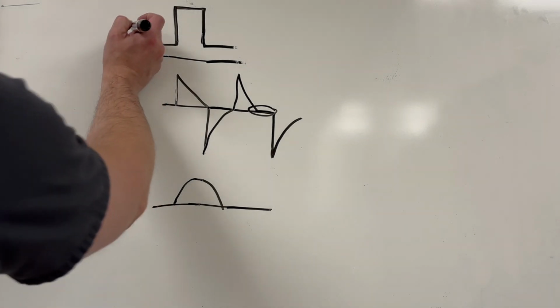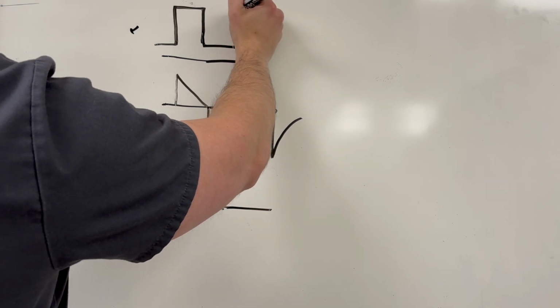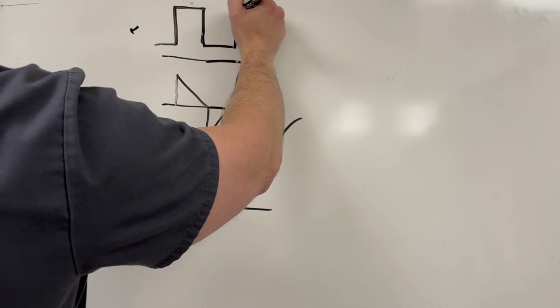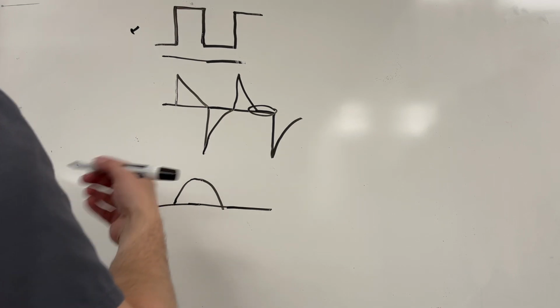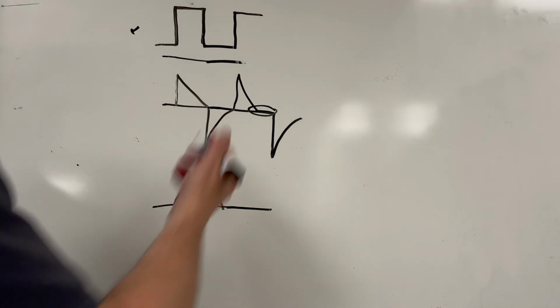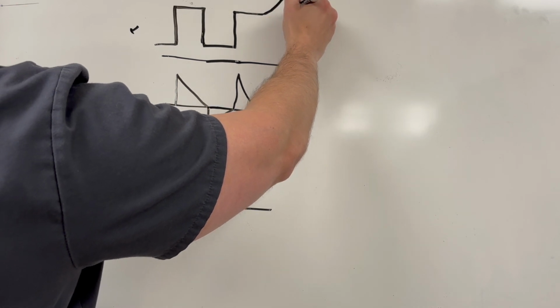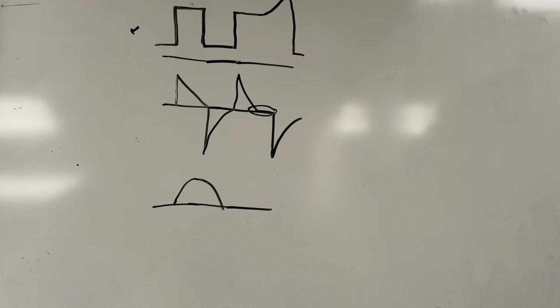So on your pressure waveform, what you're going to see is that once we start inspiration and hit our plateau right here, we hit our peak pressure, and it kind of flattens out through our inspiratory phase. Once it hits the point where it's too long for them and they start to breathe back against it, you're going to see a buildup of pressure on this right side that kind of looks like that. When you see that buildup of pressure, that's letting you know they're starting to breathe back against the ventilator. They're adding excess pressure to the circuit because of that.